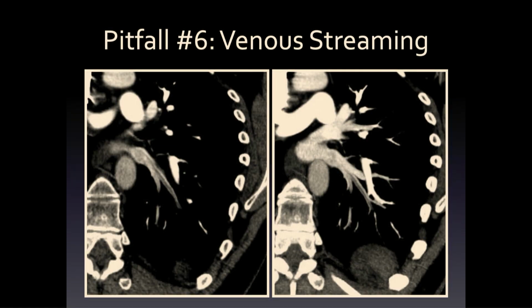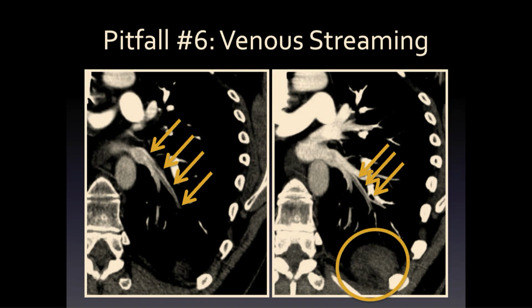And this was venous streaming. This happens a lot on the venous side. See a streak of low density. And in fact, on this bigger image, we even see why. There's a mass, so something is slowing down the blood circulating back, coming through the venous side.